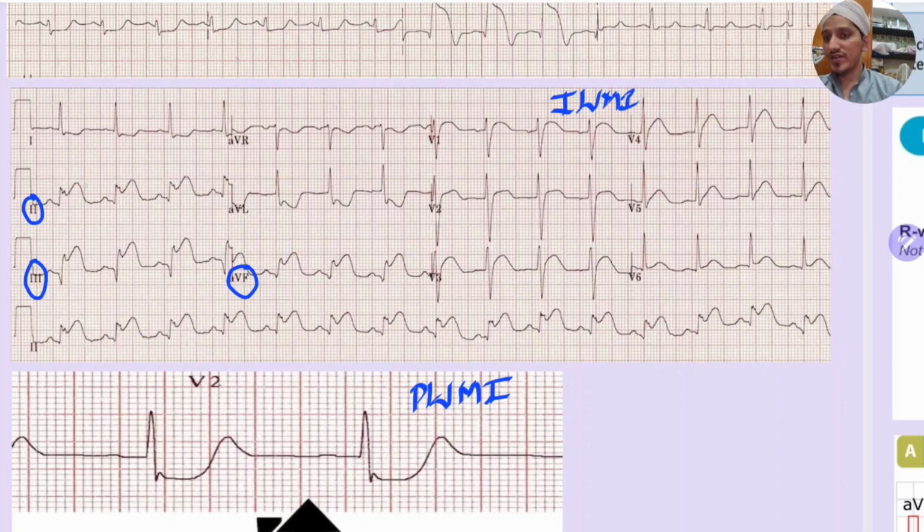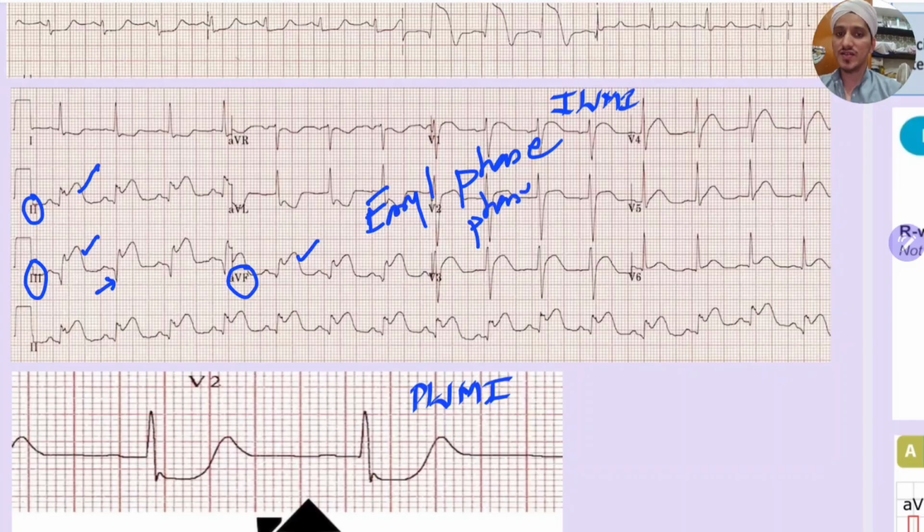See, there is ST segment elevation along with hyperacute T waves. So minutes to hours. The Q waves are still developing, so probably this is an early phase of infarction, from minutes to hours.